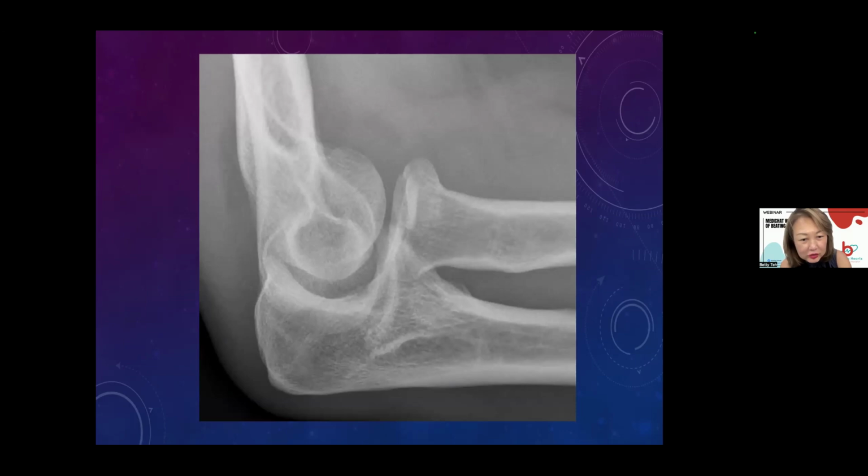Humerus fracture? No. Somebody said radial head fracture. Yes, there's a proximal radial head fracture. Very good. Not humerus, proximal radius. This one, radial head. You see there's a cortical discontinuity here. Very subtle. Radial head fracture is always subtle, so we must really look hard for this. We can easily miss it. So with pain and a fall, always look at the elbow, every part, particularly the radial head in adults.